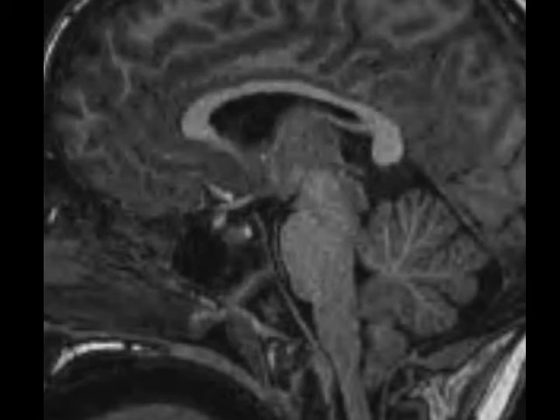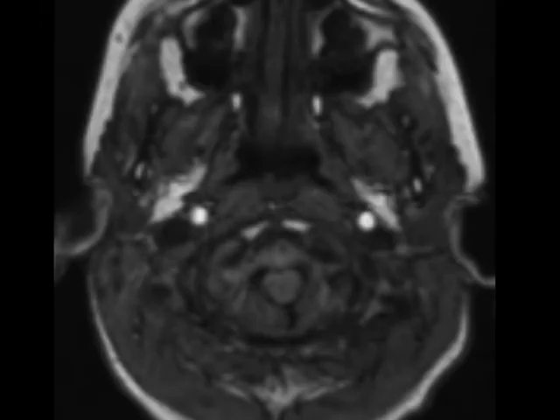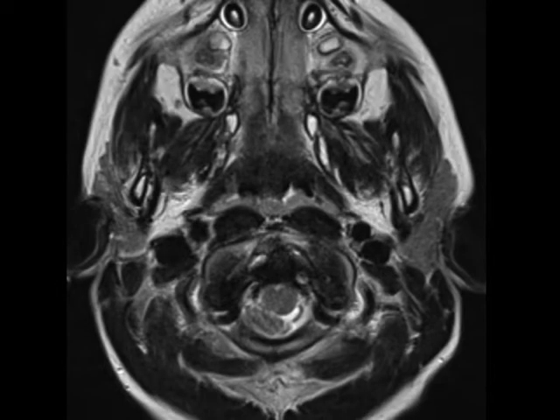This is a case of a pediatric patient with chronic recurrent headaches. We see abnormal positioning of the cerebellar tonsils in multiple planes, most evident on the right with a somewhat peg-shaped appearance, measuring up to approximately 9 millimeters below the plane of the foramen magnum. This configuration is compatible with a Chiari I malformation.